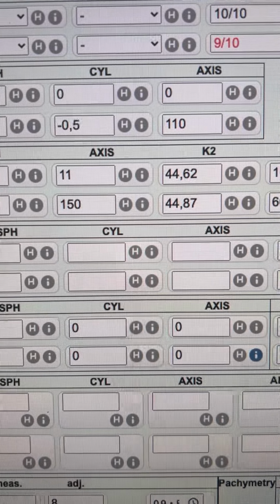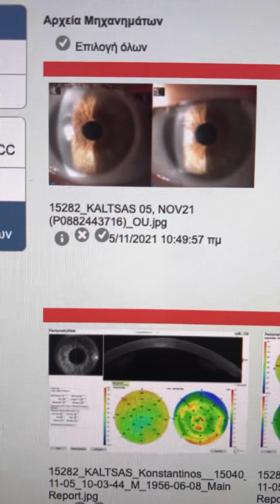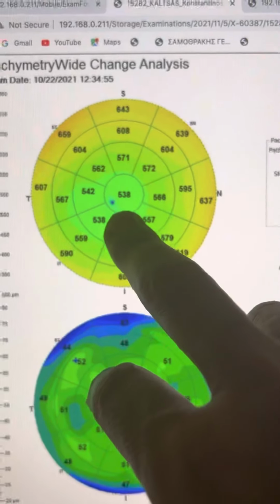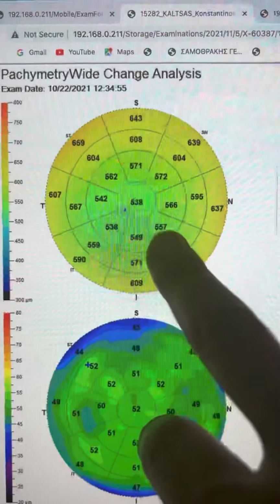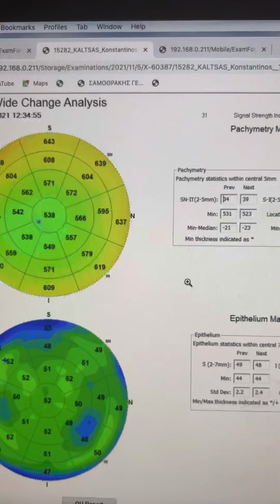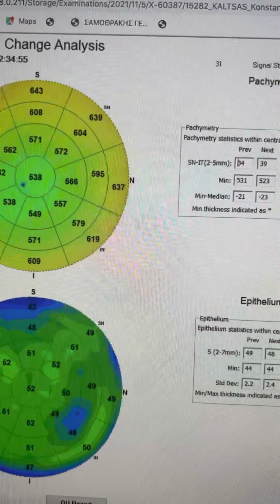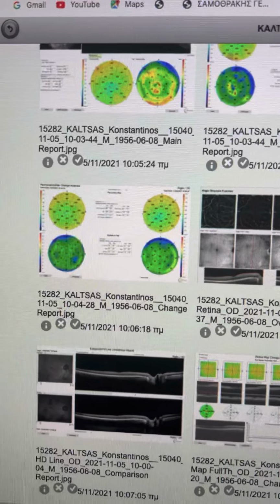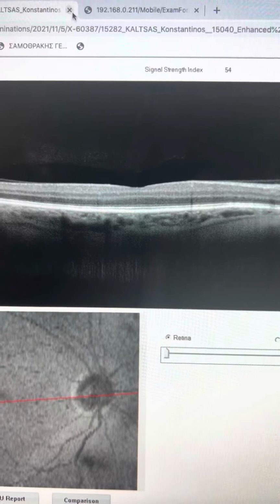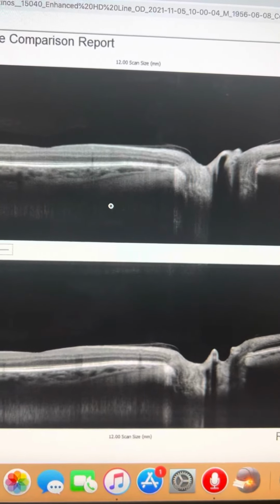Again, looking at the data is the proof in the pudding of how the cornea has changed. We'll also look at the corneal pachymetry images here, 538 at our last visit just a few weeks ago, now 530. So the cornea has thinned and steepened in this particular situation, and has affirmed our preoperative calculations. We also look at the macula, to make sure that once steroids are off, we don't have rebound CME. We use a tail of 2 weeks of Bromfenac.